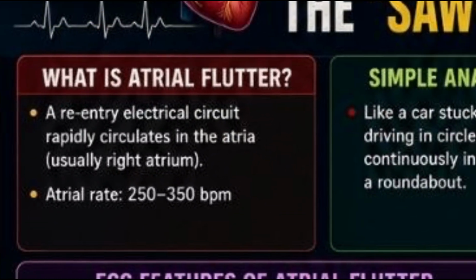What is atrial flutter? Normally the SA node sends one electrical impulse that spreads through both atria.